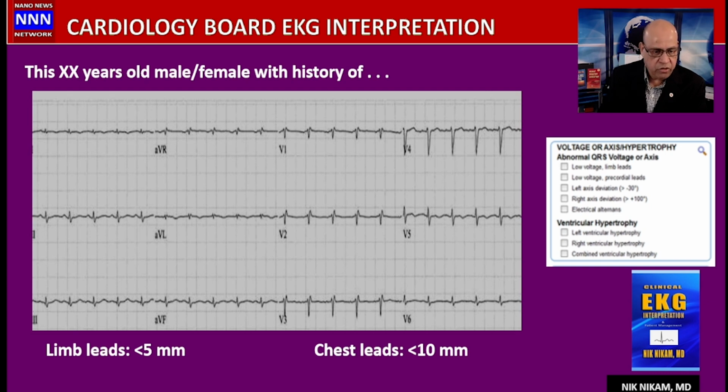The EKG could be an important clue as to what the examiners are looking for in the overall history and presentation of this patient, and what tests you order and how you manage those patients. Also, if you look at the ST-T segments, they are important as well.